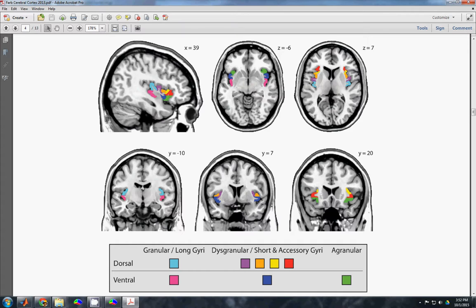I'd like to make very explicit that what I'm looking for is making sure you capture the long gyri of the insula, both the top and bottom ones. So that's going to be number 1 and number 6. You should definitely have some capturing of the middle gyri in the insula, so at least a number 2, and then potentially a 3 and 4. And then you should definitely have a number 5 and a number 8. Maybe also get that lower middle gyrus if you can distinguish it.